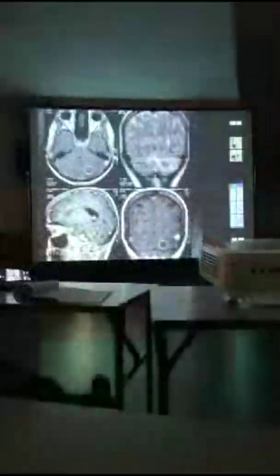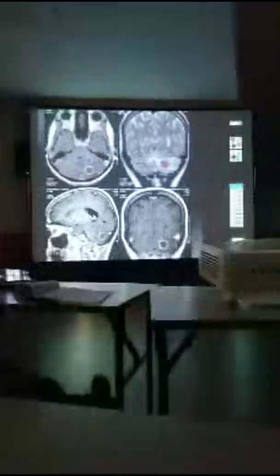of metabolites. This is a very classical manifestation. You can see the low signal center. This is caseating tuberculosis. Whenever there is a low signal center, this is caseating tuberculosis, with ring enhancement, and you can see the lipid peak and absence of the rest of metabolites.